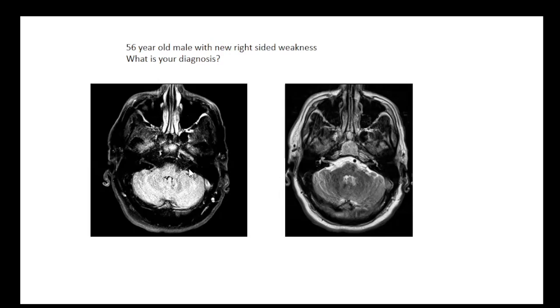So sure, I could be hiding something here in the brainstem. But I want to show this to you. This is a left carotid occlusion. I think this was from a cervical dissection. But look for that finding in patients who have new neurologic deficits, because it may tip you off, not so much that the carotid is occluded, but you may have a critical stenosis.